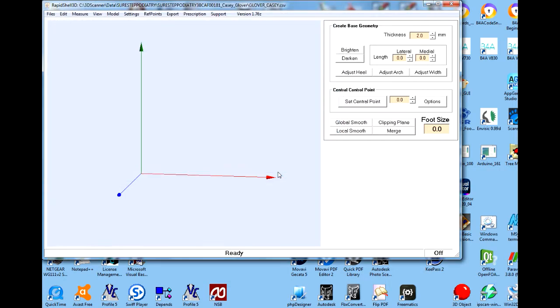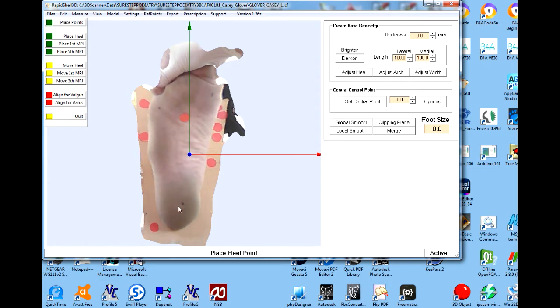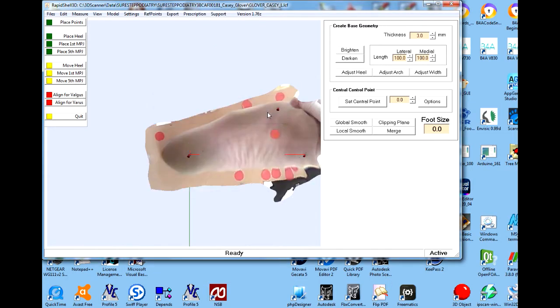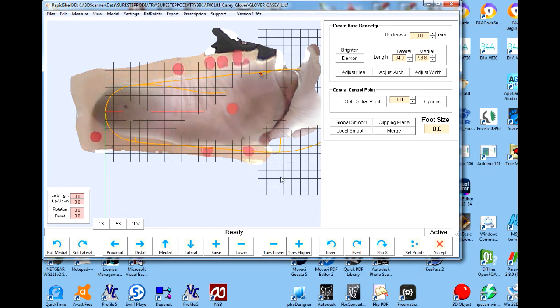We open the script file. We then display the left foot. We now need to align the left foot, place 3 points, heel, ball of the foot, adjacent. We align that. The difficulty I had in placing the points was because my mouse buttons are wearing down and the middle mouse button pick is a little less than ideal.